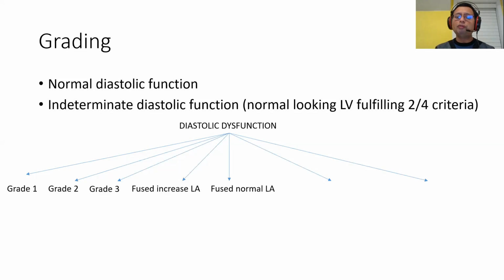So now I have shown you 5 types. What other type is there? One of the most difficult parts in terms of diastology is someone with significant mitral valve disease: significant mitral stenosis, mitral regurgitation, and prosthetic mitral valve. In this situation, most of the time, you have indeterminate diastolic function, you cannot determine the diastolic function, or even if you can determine diastolic function and estimate the LA pressure, you can't really tell whether the LA pressure is elevated because of the left ventricle disease or because of the mitral valve disease. So that is the most complicated one.